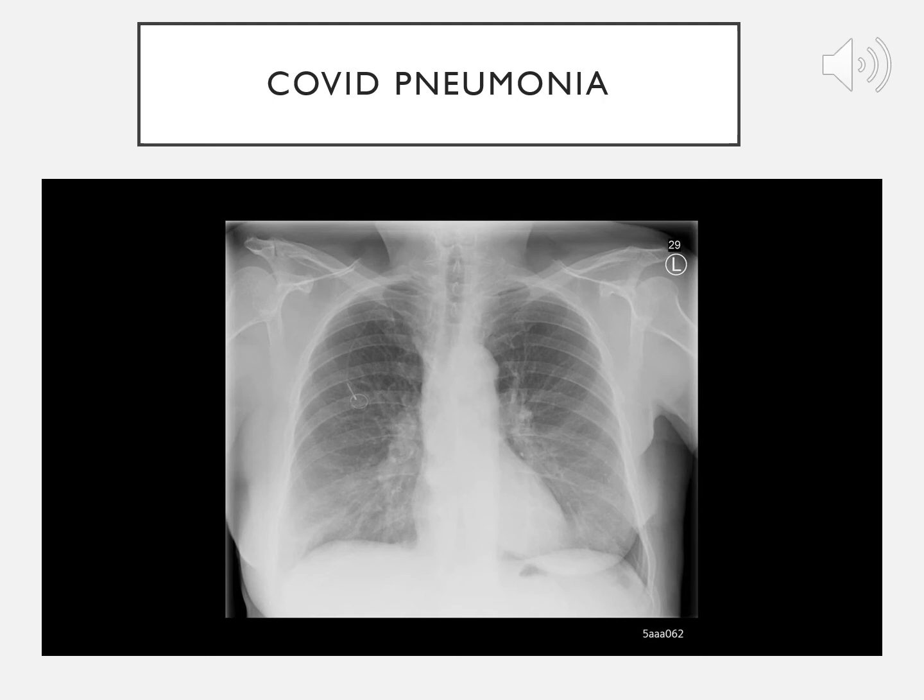Covid pneumonia, when you look at this, and this is not a very profound example, but this is what a typical Covid pneumonia looks like. You can look and see in the interstitial space, and I mean in the interstitial tissues, you can see the ground glass opacities, which when you look at these lung fields, it looks like there's pieces of ground up glass in there. This is typical of viral pneumonia. Covid pneumonia normally is more widespread and affects both lungs and all lung fields, where some viral pneumonias or pneumonitis isn't quite as widespread, but Covid pneumonia, widespread, ground glass opacities, no definite walled off infiltrates or lobar appearing pneumonia.